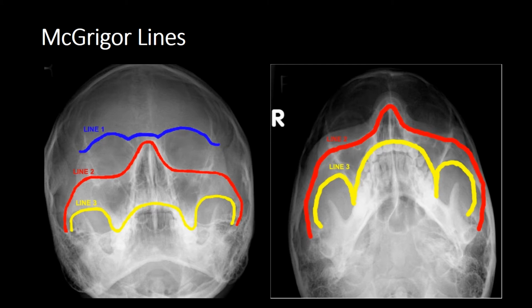And as you can imagine, it's very good at assessing for diastasis of the frontozygomatic suture, fractures to the superior orbital rim, and, if the patient has a frontal sinus, for an air fluid level within that. Remember, sinus pathology can present with an air fluid level, so an air fluid level does not necessarily indicate that there is definitely a fracture.